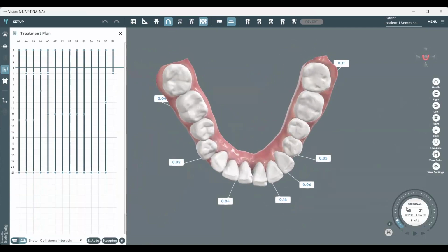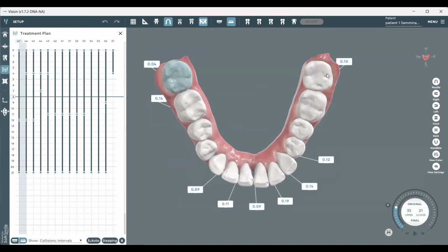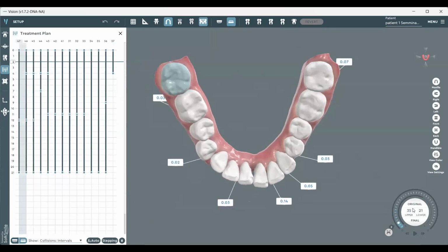First, we are going to expand, right? Especially this area. And contract 7. This is going to help us to expand in a better way when we are contracting and expanding. Contract 7, expand premolars, help us to improve the arch form, but also give stability on the movements, because we are going to create pressure here.